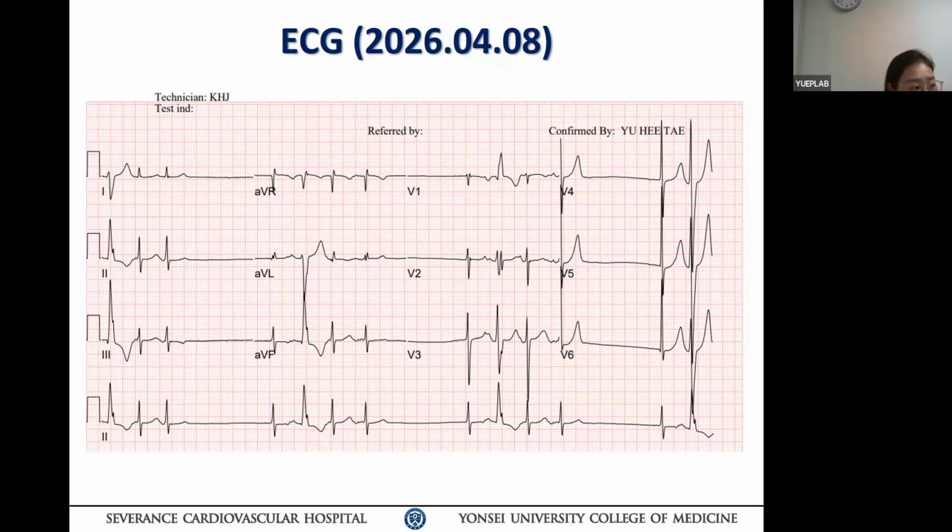Okay, that's right, exactly. So the normal electrophysiology is bradyarrhythmia, prolonged refractory period. Okay, so preceding long RR interval, the prolonged refractory period, and also the repolarization heterogeneity, and the following premature beat generate a partial and functional conduction block, making the bundle branch block pattern.